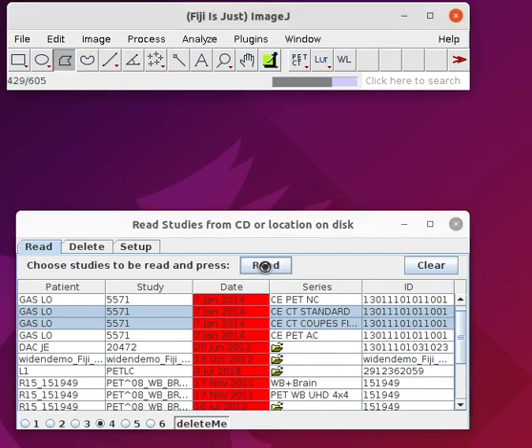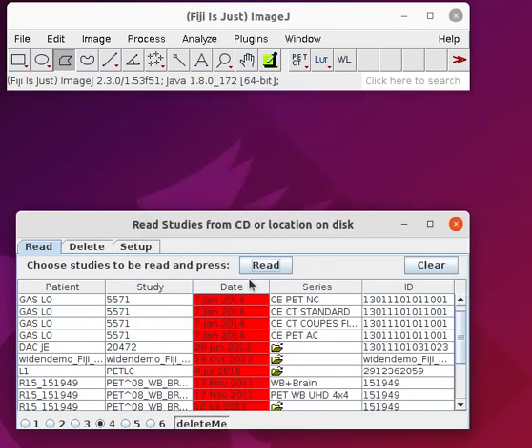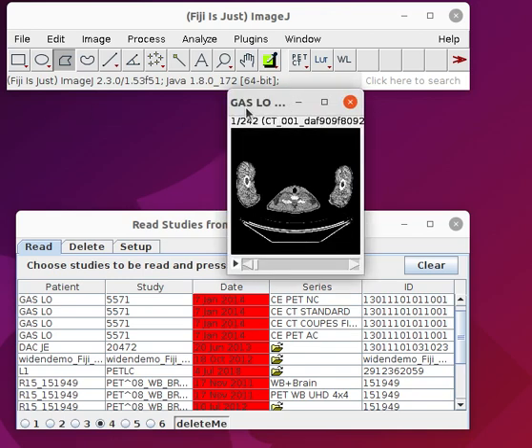I was bringing them up. Bring this over. I'll expand it a bit. The plus sign.